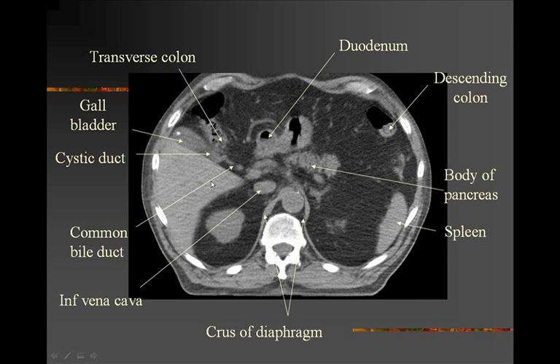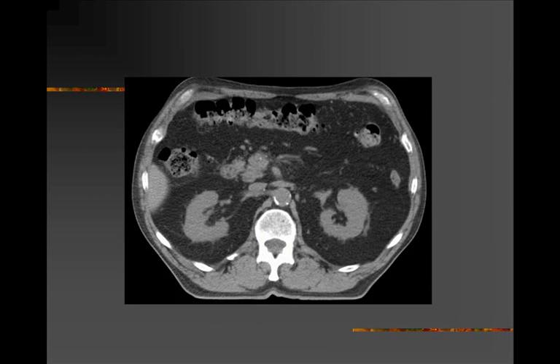Note interestingly that the gallbladder has a radio-opaque shadow. This most likely corresponds to a gallstone. This is, however, uncommon because most gallstones are not radio-opaque but radiolucent. Thus, the best investigation to pick up gallstones is ultrasonography.